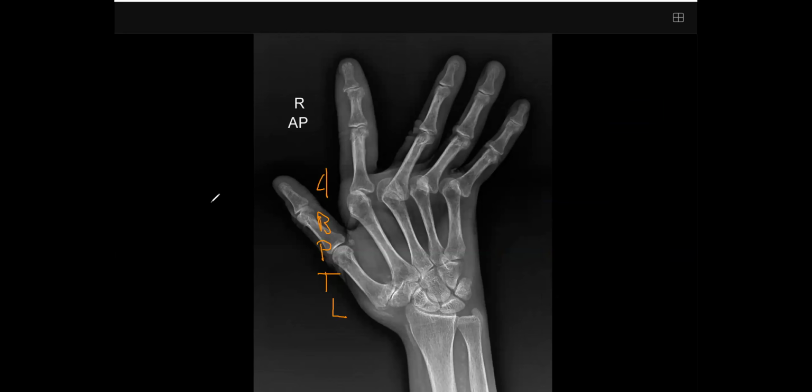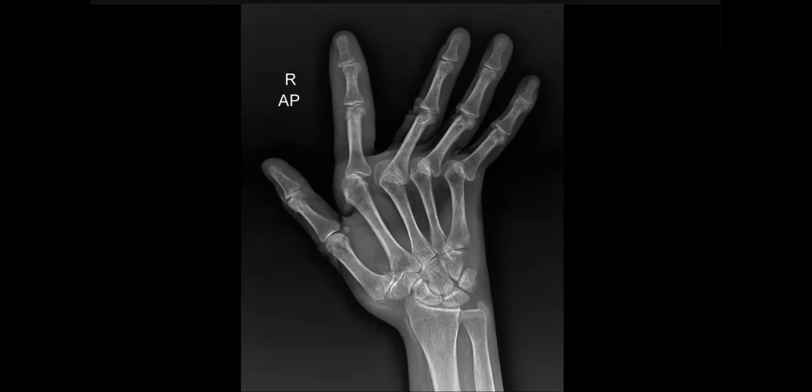Okay, hand pain. This is the dorsopalmar view of the hand of an adult patient. There is joint space narrowing of the metacarpal joints noted with subchondral sclerosis, and there are also subluxations mainly involving the third to fifth metacarpophalangeal joints, with lateral deviation of distal fingers. Ulnar deviation. No erosions.